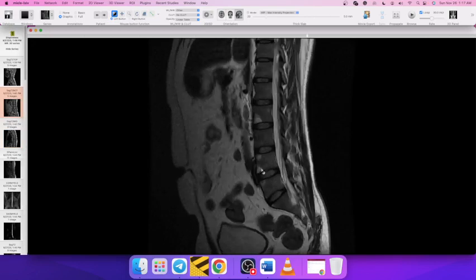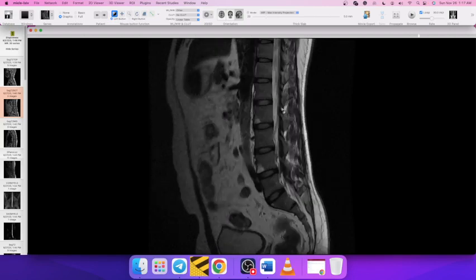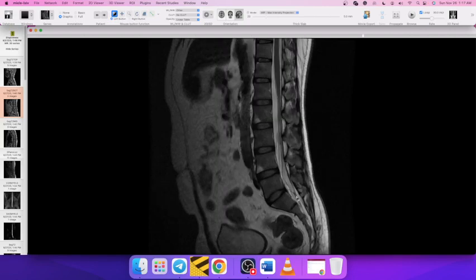We can see that there are some corner lesions here which are hyperintense, and on these T2 images we can see that the conus is terminating at, counting 5, 4, 3, 2, 1, the L1-2 level. Make sure you always check that. Make sure that the thecal sac does not extend too far down into the sacrum, and then make sure the filum terminale and the cauda equina, everything looks good. There's no tethering of the cord, and we can see that there is a mild amount of desiccation here, lesser than the cervical, but definitely still there.